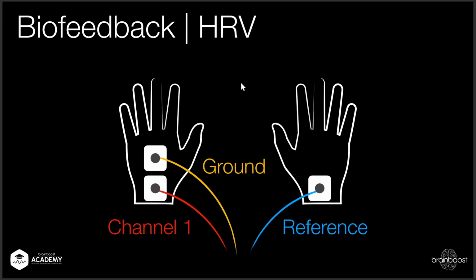The HRV. This is how I like to do it when you have HRV channels, but there's a ton of different approaches, obviously, and you can put the electrode in whatever place you want. You can do this with an Apple Watch, for example. Place your right index finger on this crown, I think it's called in English, and then it will do the same as what we do here.